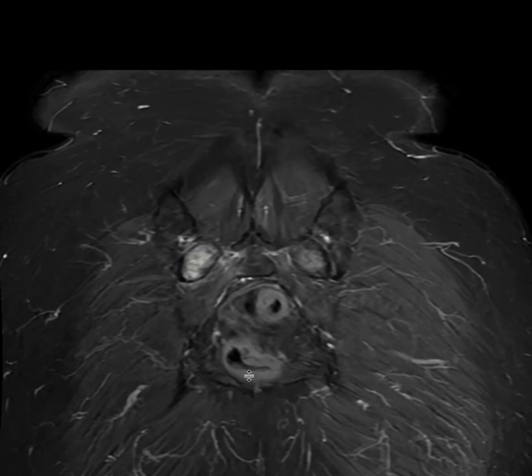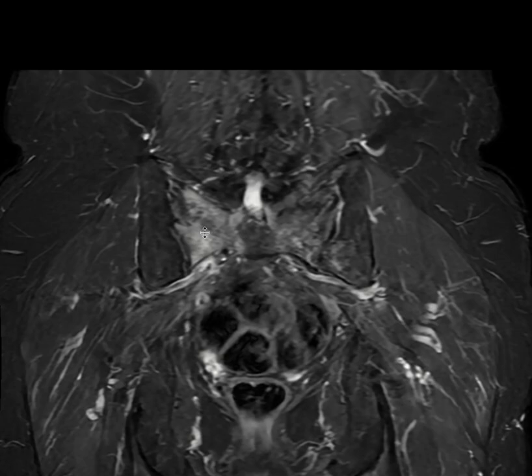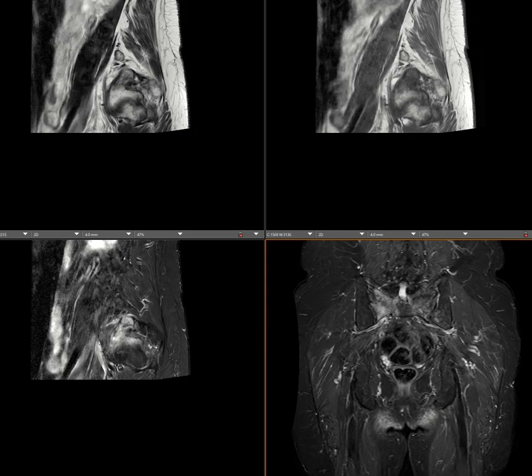Let's look at the dedicated pelvic imaging here. This patient also, because they had pain, acquired a separate pelvic MRI, as you see here. So we see all these areas of abnormal edema in the region that we already saw on the sagittal and coronal sequences. Again, on the STIR sequence, we see lots of edema here. So this is basically the MRI feature for sacral insufficiency fracture.